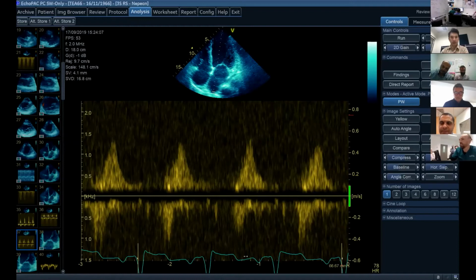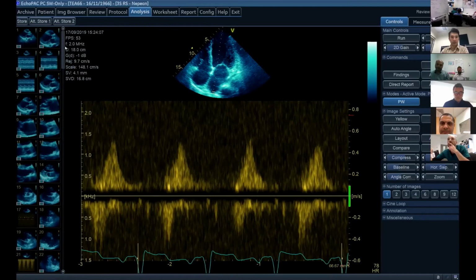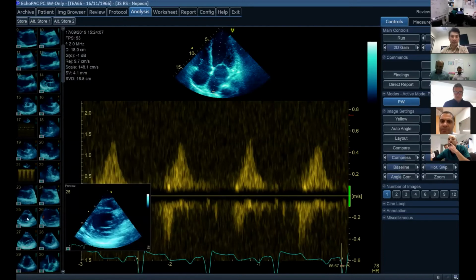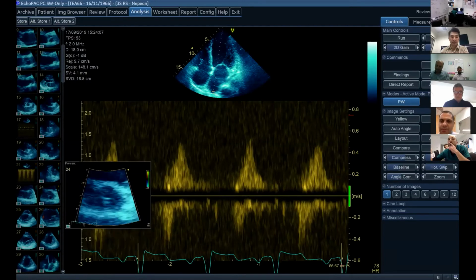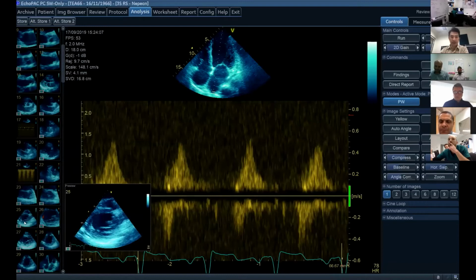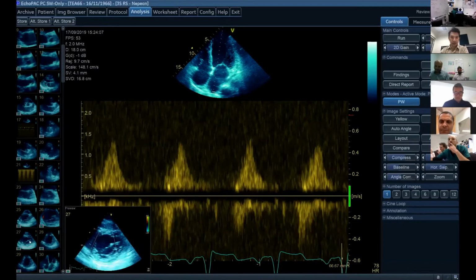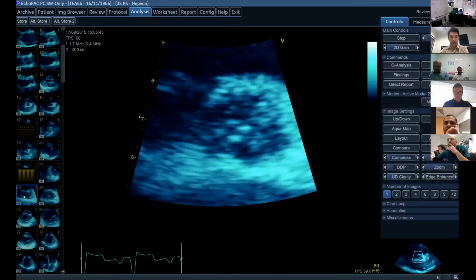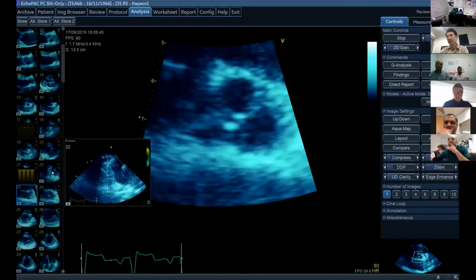So we were talking about ischemic heart disease. So let's talk about regional wall motion abnormality and how you go about assessing regional wall motion. Ray, I think you said that you thought the anteroseptal wall was akinetic, hypokinetic. Severely hypokinetic, I thought, from memory. Okay. So again, what's the terminology for regional wall motion abnormality? Take me through severities. Oh, gosh.